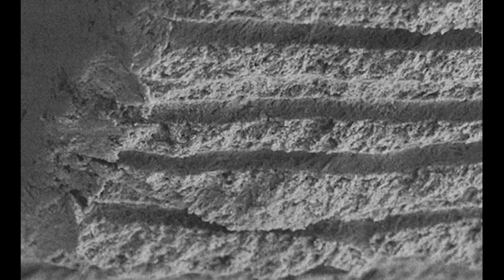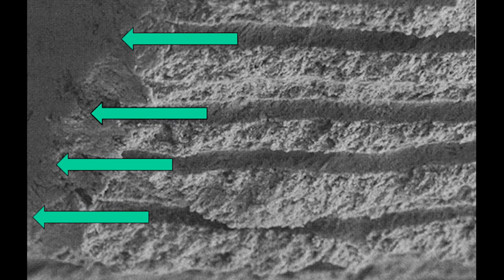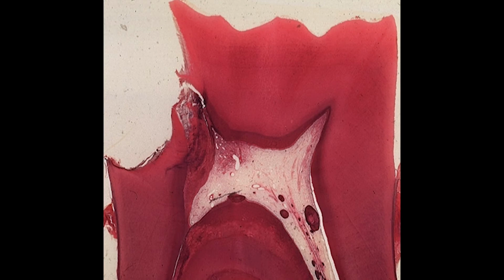Pressure changes in the dentinal tubules can stimulate the nerve fibers based on hydrodynamic theory of Brännström. Cold stimulus causes outward movement of the dentinal fluids, whereas heat stimulus leads to fluid expansion and inward movement of the dentinal fluids. In inflamed pulp, the reaction to cold and heat are exaggerated and cause severe pain.